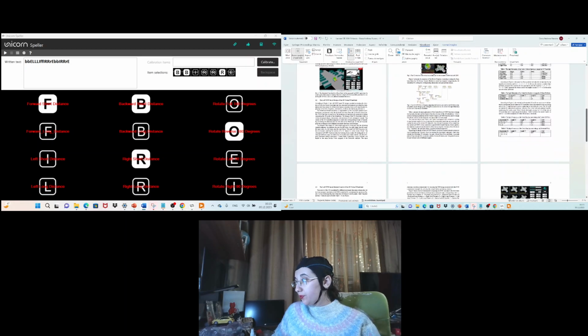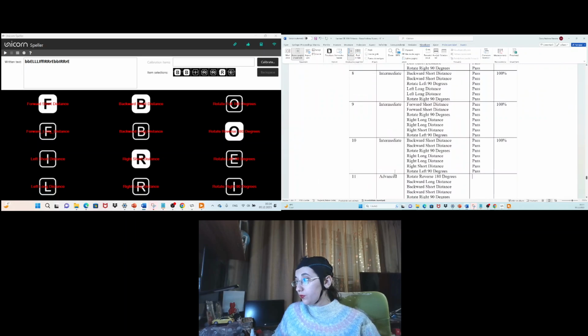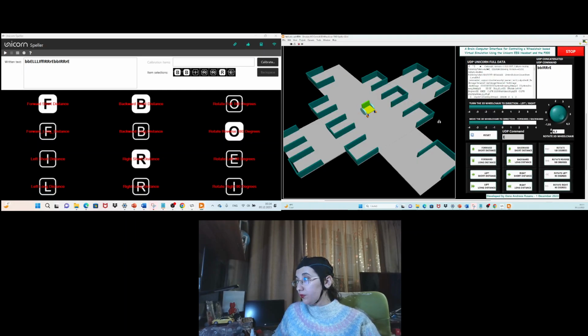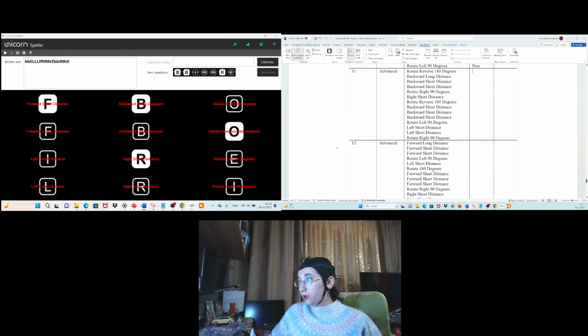Okay. I will stop and restart the LabVIEW application to save the resources of the computer.